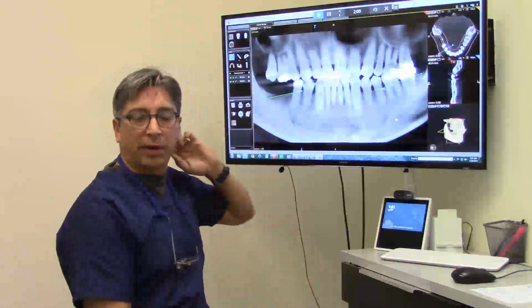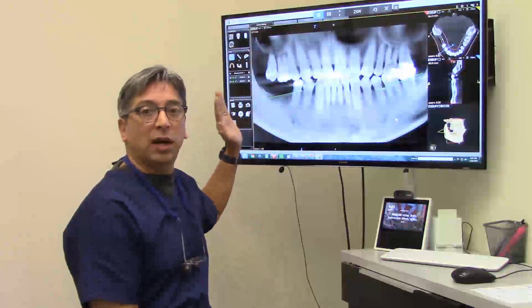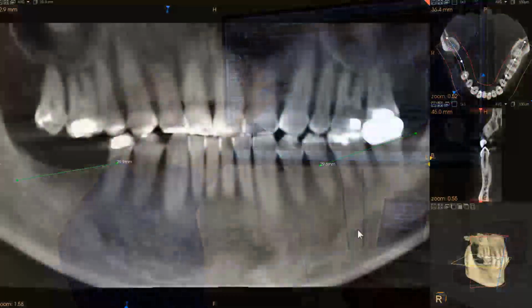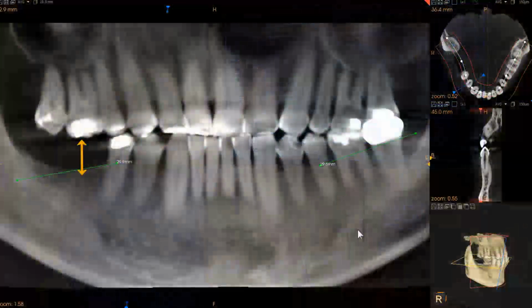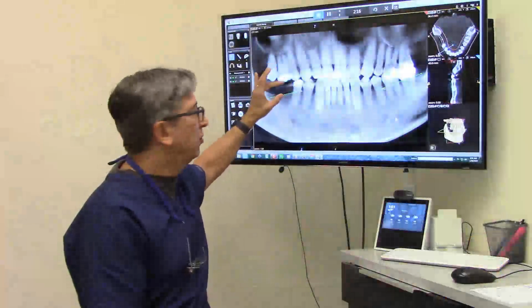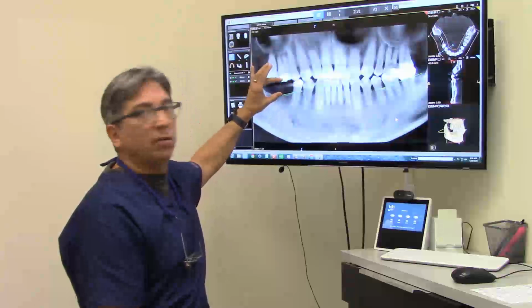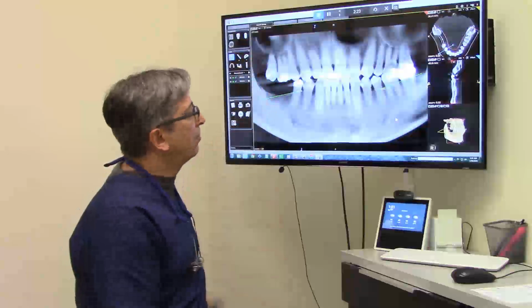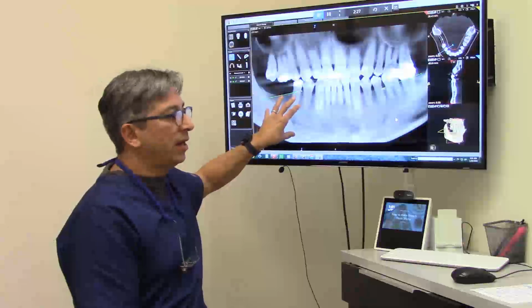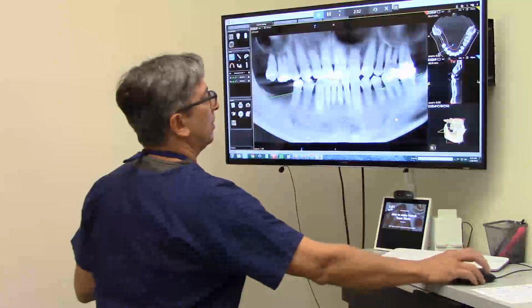It does have a little bit of a concern if you do second molar implants, which I don't do. You can have more of a concern in terms of how high the crown is. In the first molar position, which is fine, I don't mind that at all. That's where I only go to. And we have a decent amount of bone to crown ratio, so we like that. So this is ridge height. I would give them a yellow. The other categories are green, so we're not going to talk about those.